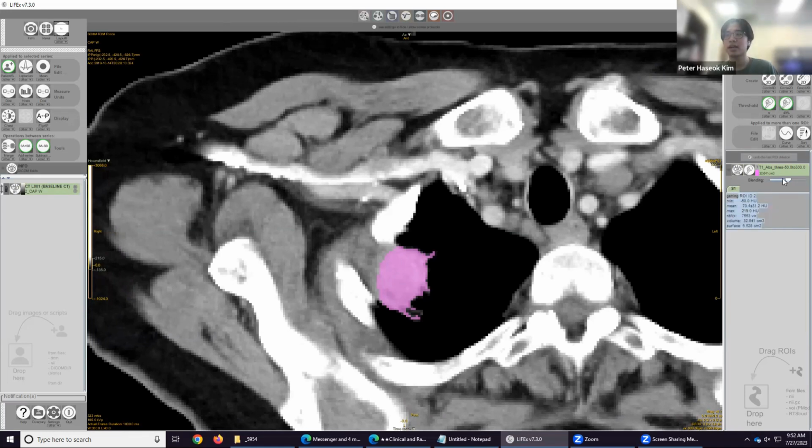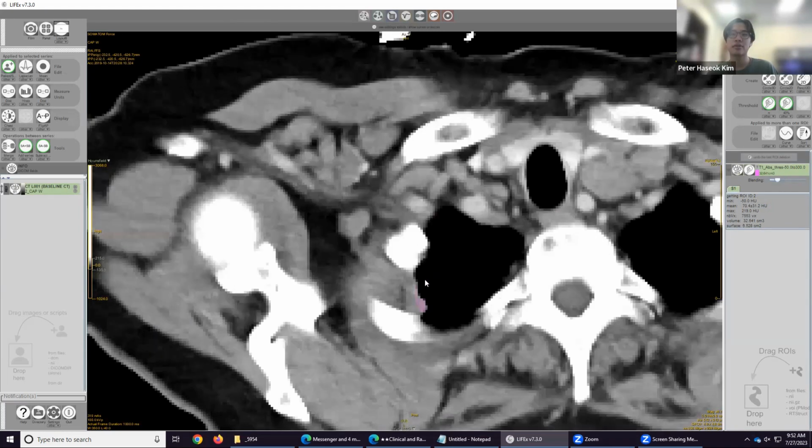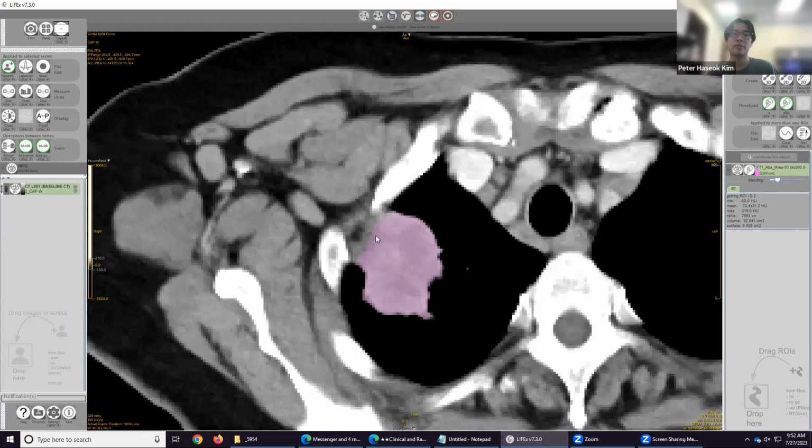You don't have to look at that. If you slide the blending scale, you can see that I can make the color lighter so that I can see through it clear. It'll be a lot more translucent. And so that just makes it easier for us to determine margin after we've colored it, just to double check.